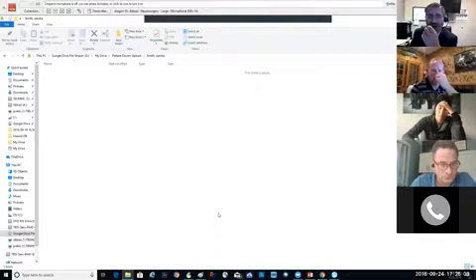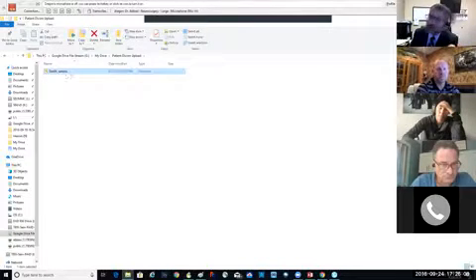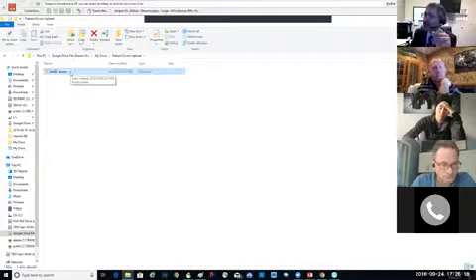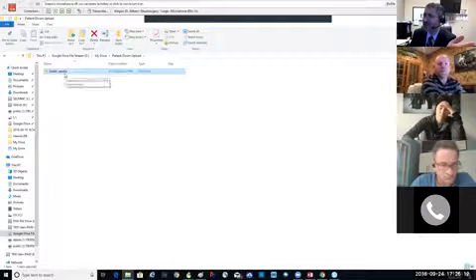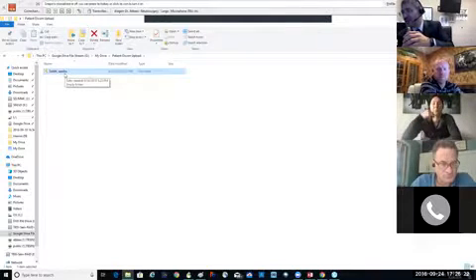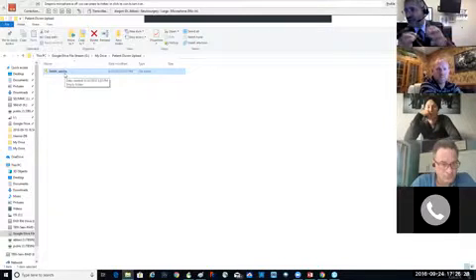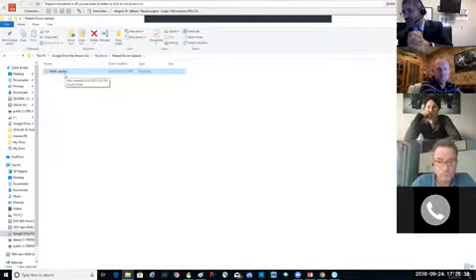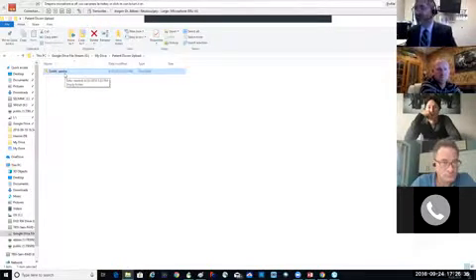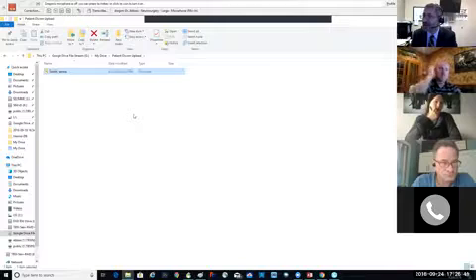Obviously, you have to make sure you give that patient access only to this drive. Otherwise, they can see all the other patients' X-rays and so on. And as a matter of fact, I think once you upload it to the XIView, you can delete it. So you give them access to the drive, they upload it, you put it on the XIView, then you delete it, or you can leave it there. Then practically everybody can have access to the films. Once you do that, it doesn't matter where I am. I can access the films.